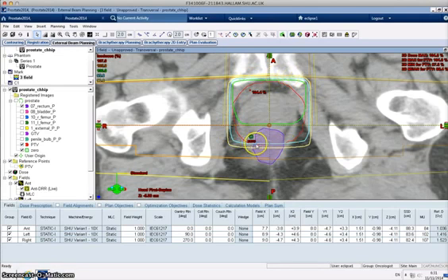red. Now we've got this three field technique, so we're always going to have a square in the middle. So we're not going to be able to conform around these corners using this technique, but what we are going to do is be able to move the square tighter, or the rectangle smaller or bigger. So if we think about this slice just to start off as a demonstration, we can see that, as we said, it's too wide there and too wide there, so laterally. So that's the thing I'm going to sort out now.